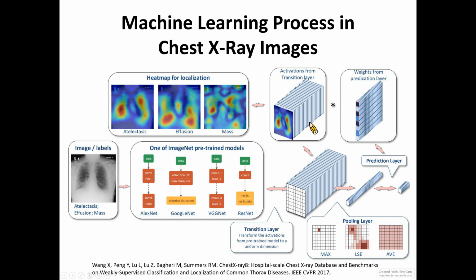Okay, so we will use this data set to learn how to use transfer learning. Before we work on transfer learning, I want to show you the example provided in MATLAB to see how it works. Here I show you the browser using Chrome, and you can just type MATLAB transfer learning examples.